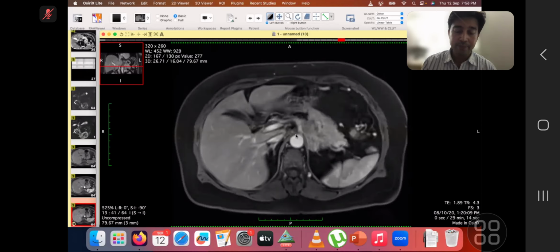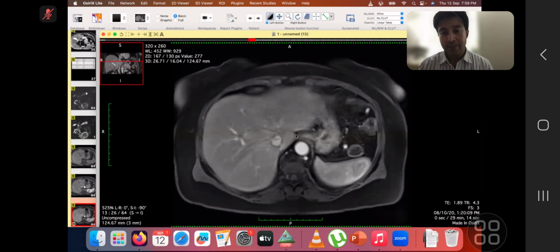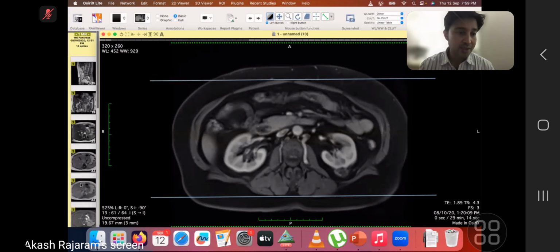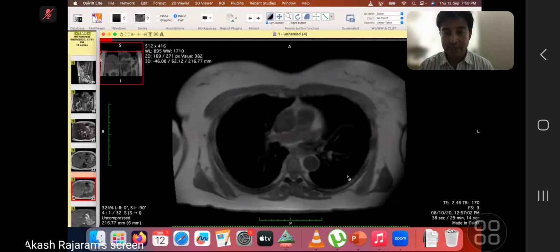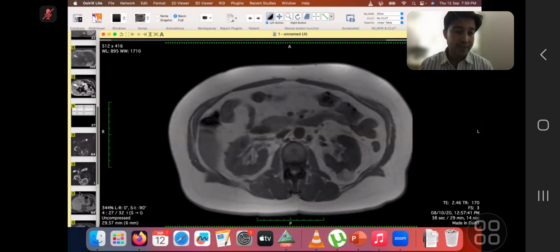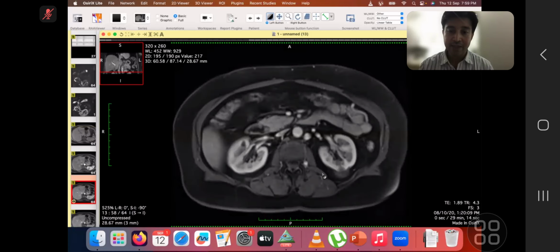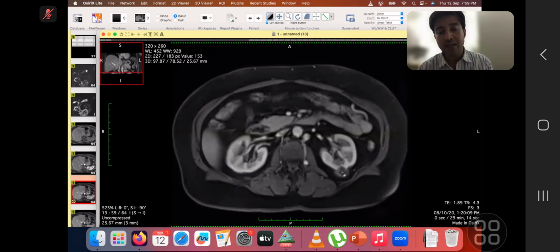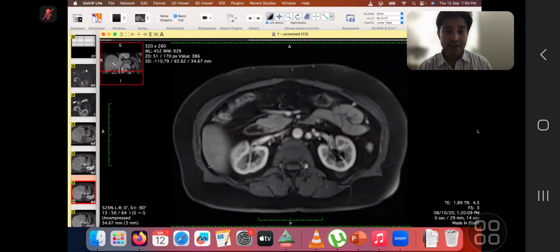On the MRI, this lesion, you correctly picked it up that it is enhancing, but you see that we go to the T1 weighted images. You see it is hyperintense on T1. Okay. We go to the fat suppressed images, and you're seeing that there is fat suppression with some enhancement in the region. There's central fat suppression. There is some peripheral enhancement. So this is a very typical appearance for angiomyolipoma. Fat attenuating lesion with blood enhancing components. It's an angiomyolipoma. Other than that, you see this lesion.